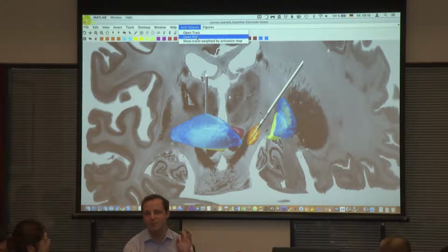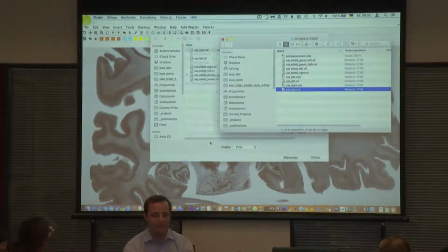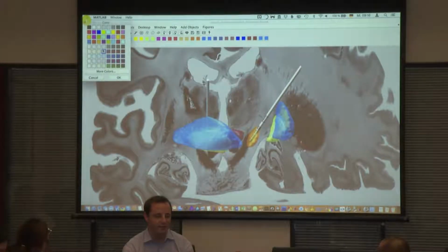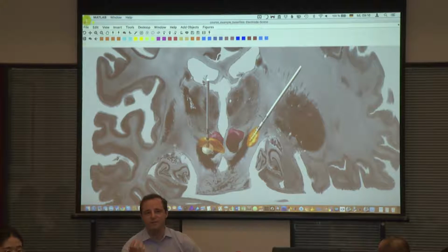So you basically can run any nifti file, show any nifti file here. So if I just select this right VTA, for example, I can give it a color, and then it will be here, right? So let's see. So this is now just the same, the VTA we created yesterday. Remember, Tanya wanted to use the lowest contact, and we just visualize the nifti file.